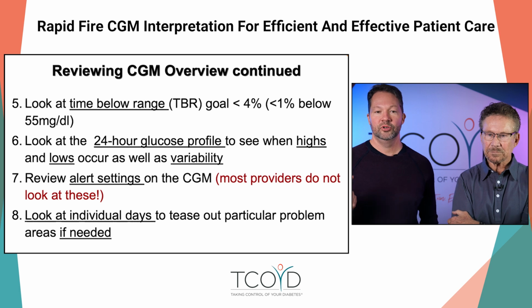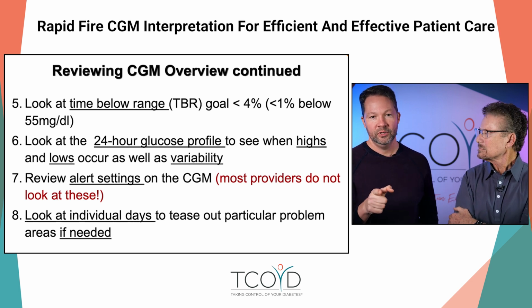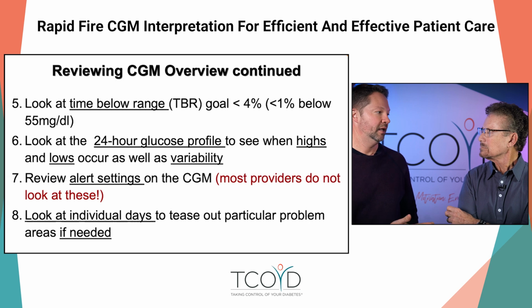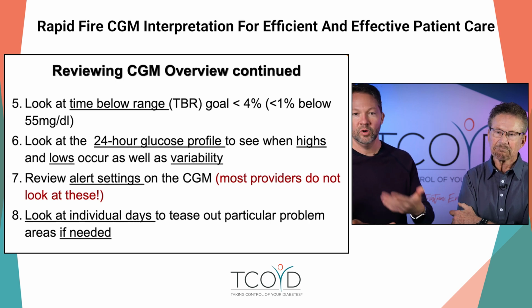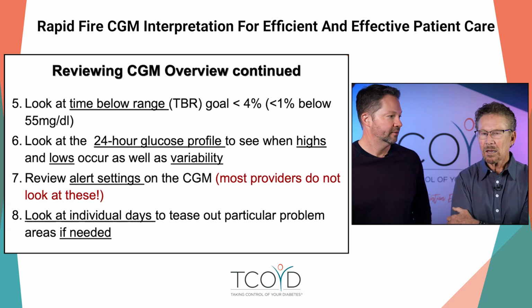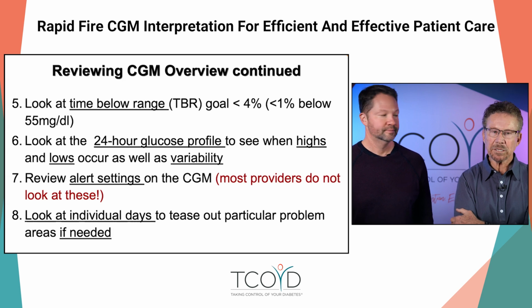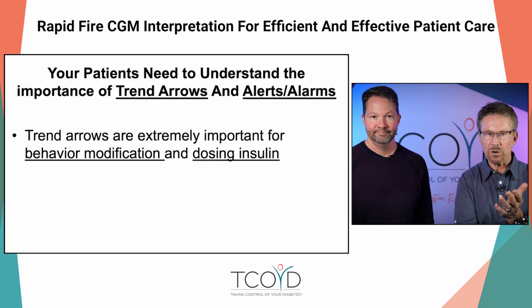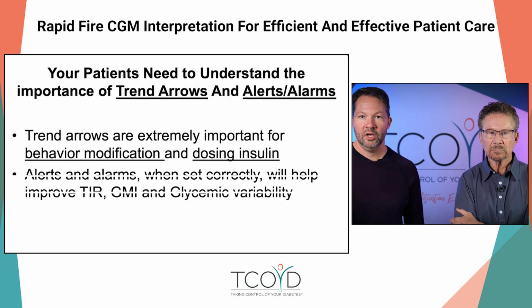Yes. And sometimes that can trigger people. The other time I really use individual days is if there's some event that they want to look at. Last Sunday I had a bad low, something like that. Okay, well, let me go back to that day and we can go through it together. It's very nice. And like I said, you may not need to do that depending on how the patient's doing, but it can be super instructive. So, and then we want to talk about trend arrows.